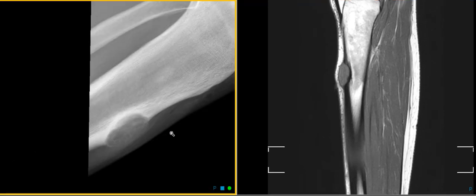Here, this is a lesion on the lateral view of the tibia. This is it coming off the anterior cortex, and there is some increased bone density, but it's not really lobulated, prominent bone density like an osteosarcoma might be. So again, scalloping of the cortex, smooth margins, and we're hoping that this is a chondroma arising from the anterior periosteum called a juxtacortical chondroma. But they'll definitely need to do a biopsy and make sure that it's not an early chondrosarcoma or one of those other surface osteosarcomas.